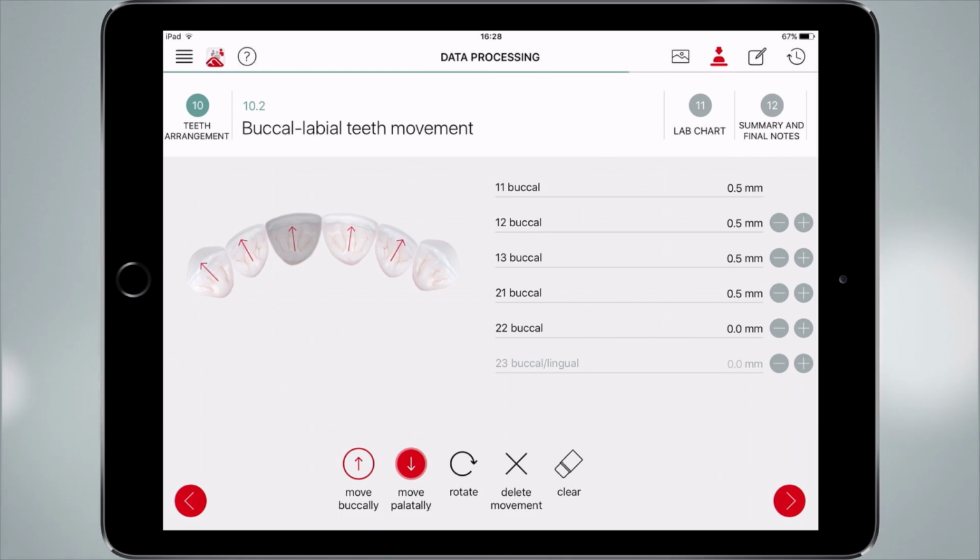So we decide to align all these teeth, but now we want to increase the lateral incisor a bit more to be really in harmony with the buccal position of the left cuspid that is already out. So now in this way we have compensated, and we are in the same position with every tooth on the buccal side.